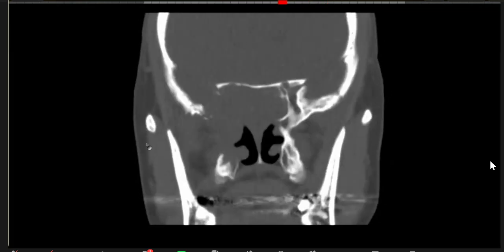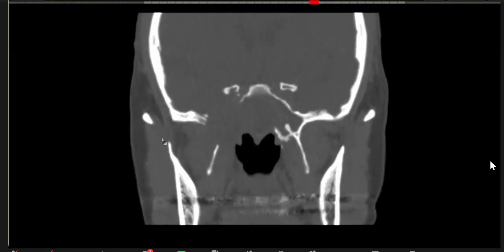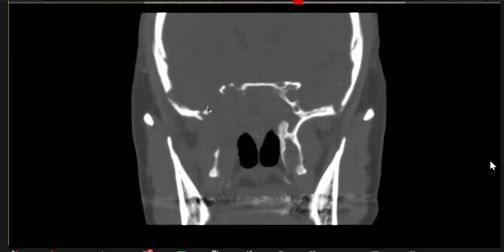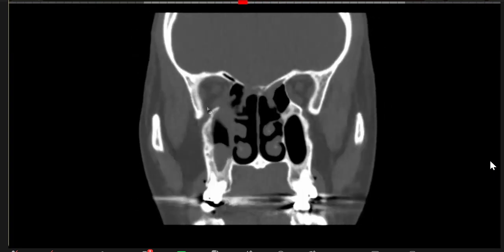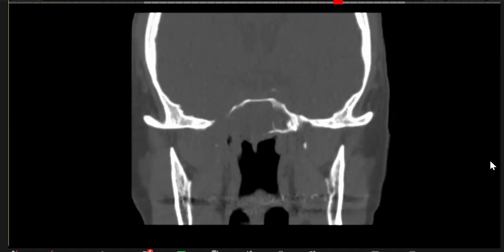And of course, I did not show the candidate the coronal, but just to make a point, you can see how it is causing erosion, and this is the middle cranial fossa. So, candidate one, well done. You got the diagnosis ultimately. Just a bit of fine touch of anatomy is what is required. Now, let me show you a normal case.